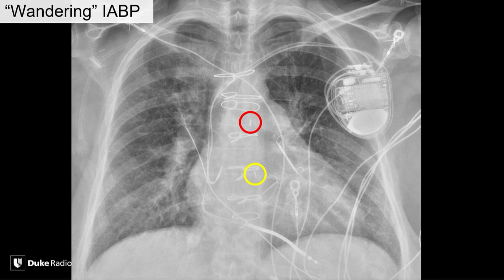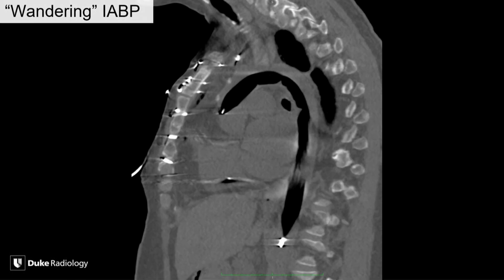And the problem with that, of course, is you can cause injury to the ascending aorta. These things can actually pop down into the left ventricle across the valve and damage the aortic valve. They can pop up into the subclavian and carotid vessels, of course, and cause strokes and that sort of thing. So they do not like to have them within the ascending aorta. Okay, but again, it's really mostly just a very high index of suspicion for an abnormality.